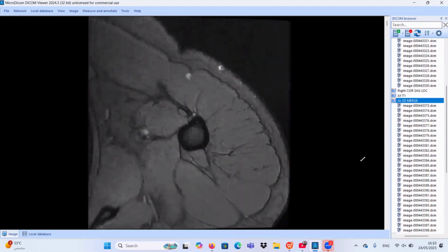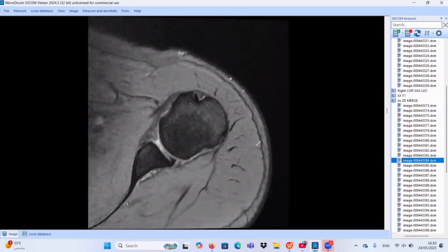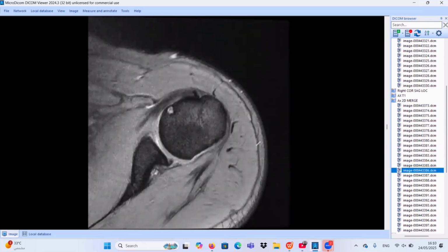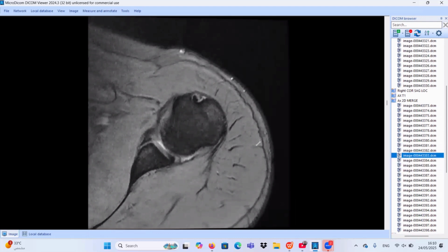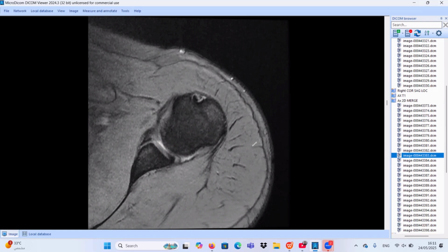Okay, let us see axial T2 gradient. Can you see any abnormality? Of course, yes, sir. At the anteroinferior aspect of the glenoid, there is a bony separation at the base of the anteroinferior labrum. And this confirms the Osseous Bankart we said before, and also the surrounding marrow edema, subtle also, suggesting this is not an acute injury.